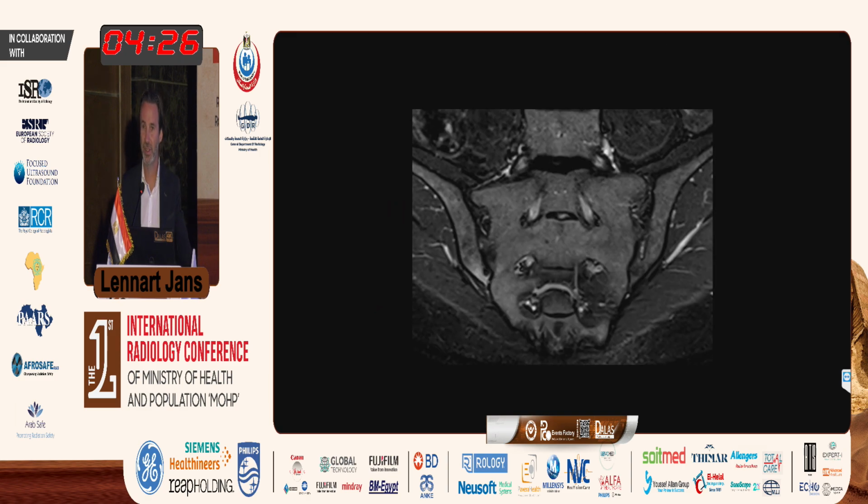Okay, so what about this case? You are the experts. There seems to be something going on in the right SI joint. There's a bit of edema there. So what do you think? Is this a patient with rheumatic disease or not? We can vote. Who thinks that this patient has got a rheumatic disease?